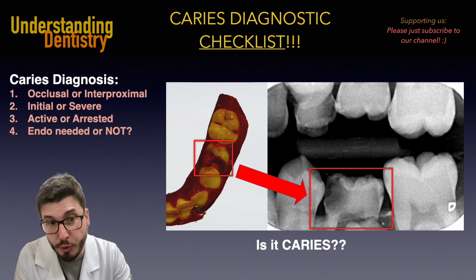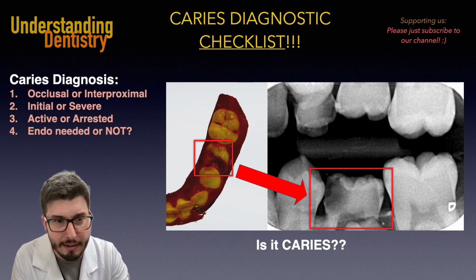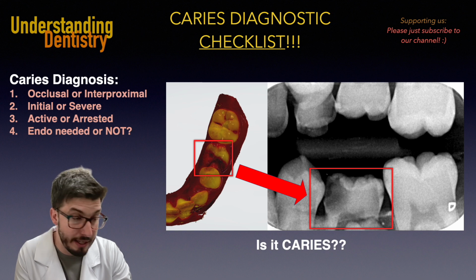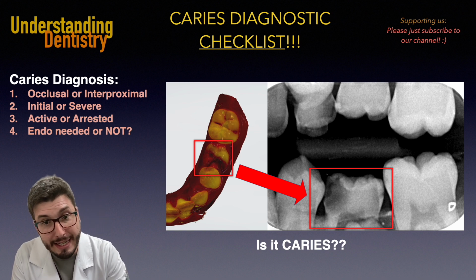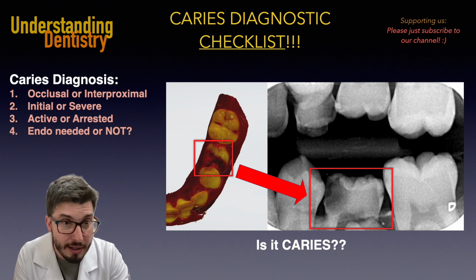And in the intraoral scans, you guys are seeing the dark red image because the areas that are darker, almost black within this area, are deeper areas. That's why you guys are seeing it like this, right? Regarding the permanent molar, you guys are seeing the last tooth here, the distal tooth.